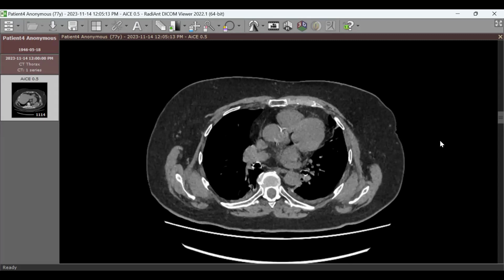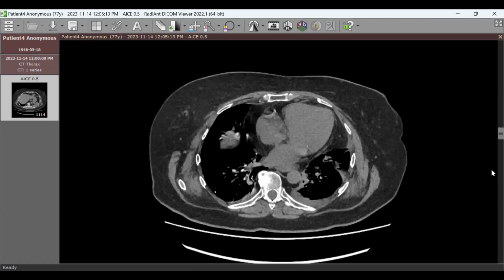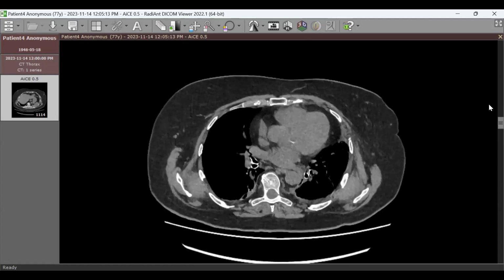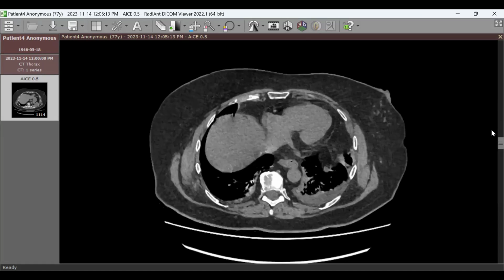Actually, these are soft tissue masses that usually occur in elderly patients, mainly I think in females. They have a classic location, inferior to the scapula, deep to the latissimus dorsi muscles. Usually it is asymptomatic, has no significance actually, and there is no risk of malignancy.